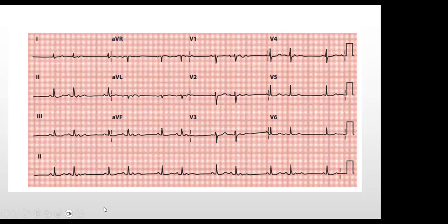They're not constant. They are constant. So we'll have 3 people now saying 3 different things. So I'm saying it's not. I think I agree with Dr. Gordon. A sort of prolongation until there's a drop, to qualify for Mobitz type.